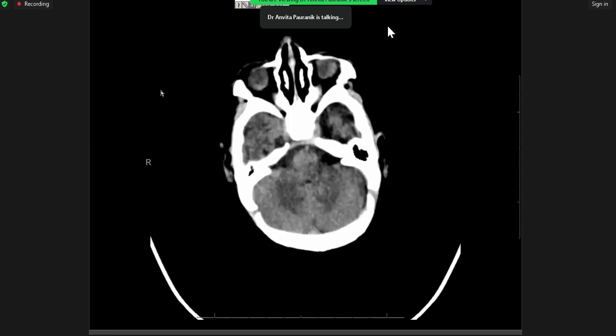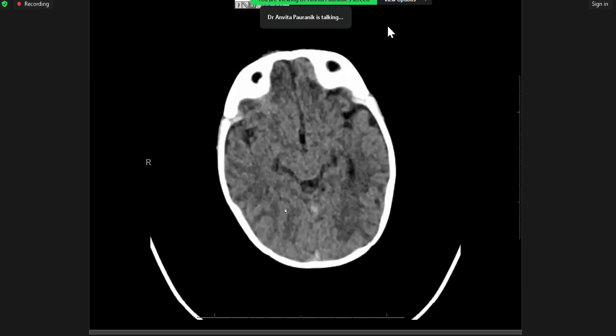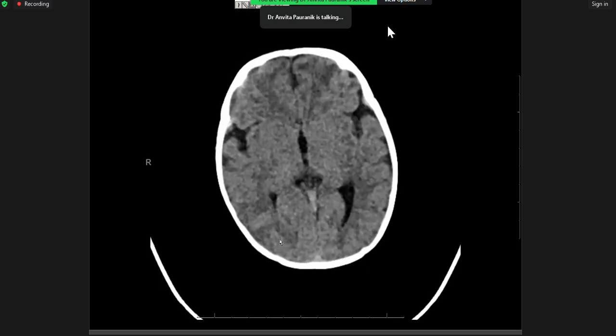Irisha, you guys, whoever said normal or whoever thought it was normal, you guys are right. So a little bit of high density in the venous sinuses in newborns, especially in the first month of life in neonates, is completely normal. And it takes time, right? It takes time to get comfortable calling this normal and not to proceed with actually doing a venogram or an MRI.